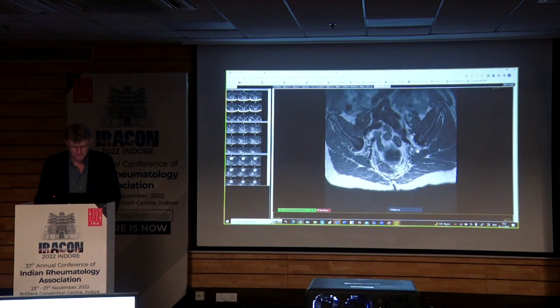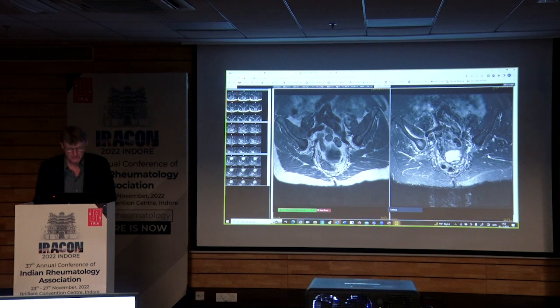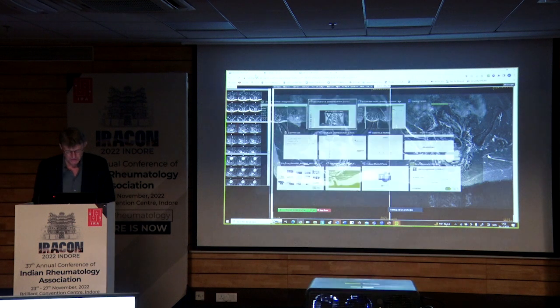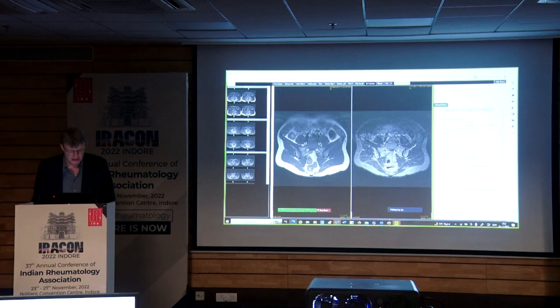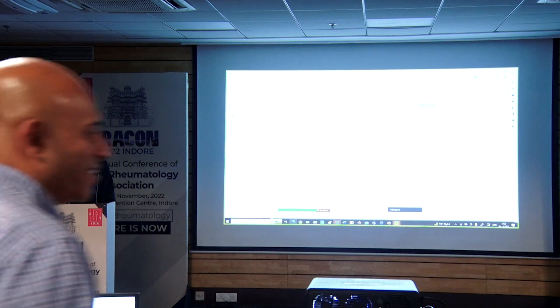So B1, SIJ case B1, and then in parentheses day 000. And there you do the usual stuff. Can you find it? B1. I'll go up here in a minute. B for Bombay. B1. This one down here.